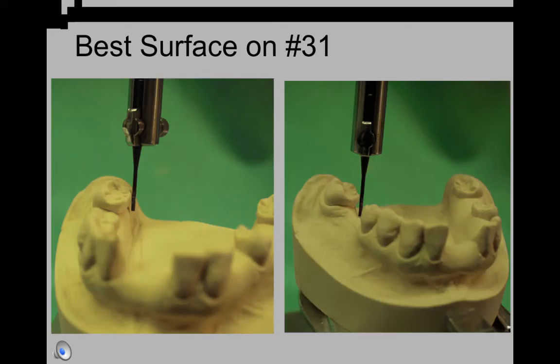You can see that the mesio and distal lingual line angles are shown on number 31. It appears that the undercut is more dramatic on the mesiolingual. Therefore, we will use that surface for the retentive tip of the direct retainer.